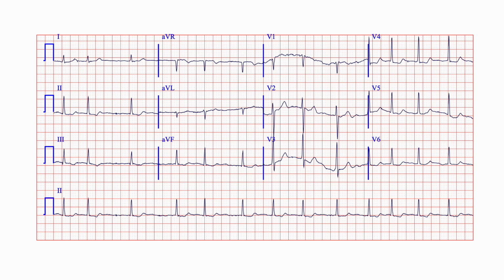For rhythm, we start by looking for atrial activity in leads 1, 2, and AVR, where our normal sinus P waves would be visible. But we see the absence of P waves and irregular distances between the QRS complexes without a discernible pattern here. A so-called irregularly irregular rhythm. Both of these findings together point us towards Afib as our rhythm.